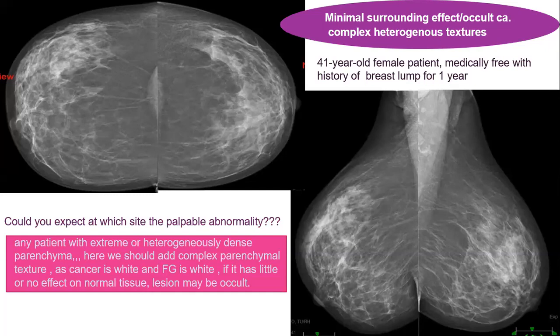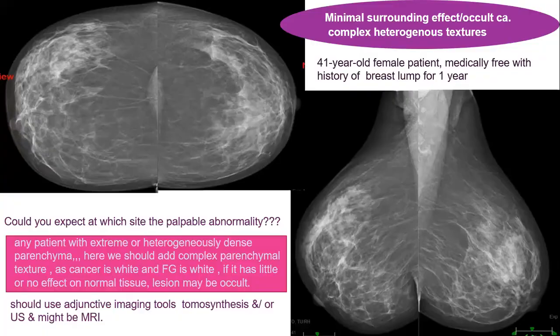Nowadays, we should use tomosynthesis. Adjunctive imaging tools like tomosynthesis and ultrasound, and probably later we can proceed to MRI.